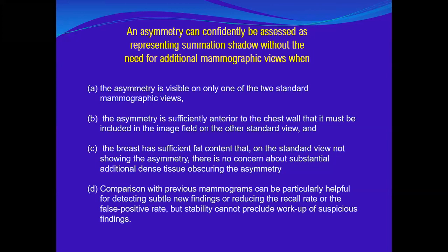The breast has sufficient fat content that the standard view is not showing the asymmetry. There is no concern about substantial additional dense tissue obscuring the asymmetry.